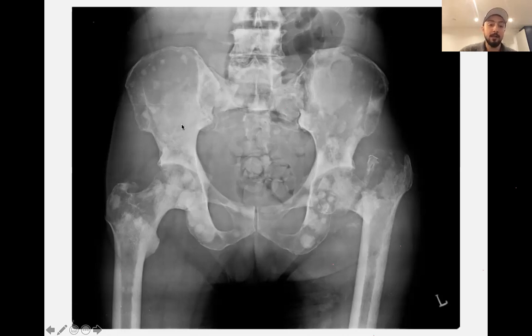That's because the tumor that is attacking the bones is causing sclerosis. As a result, the bone becomes denser and it appears brighter and whiter. So that's why you have some white spots. This is basically the cancer attacking these regions and causing them to be more dense.